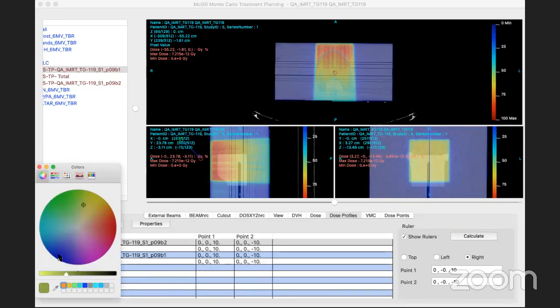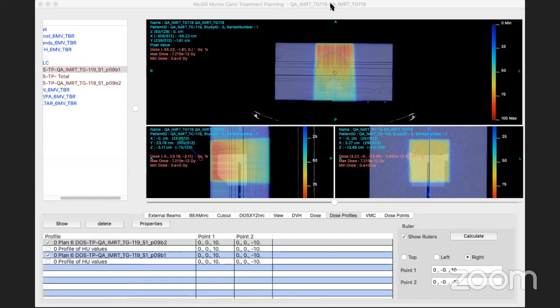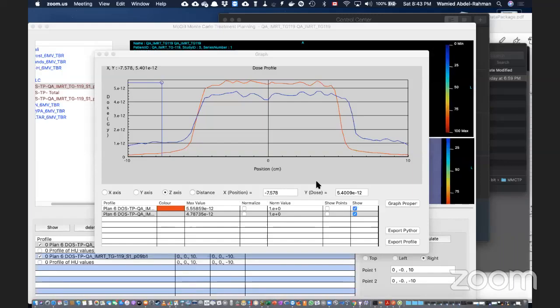It must be on your other screen. Maybe others can see the profiles. Oh, because I'm sharing. Okay, I should share the screen, not just the application. Okay, sorry. I'm sharing a window. Now I'm sharing the screen. Okay, this is the problem I'm facing.